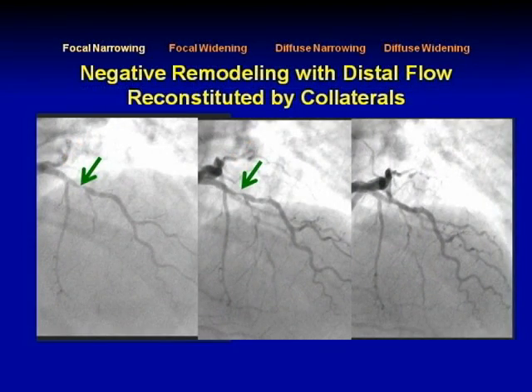that distal opacification. These are patients who have chronic ischemia, and then they have the collateral flow. Since our imaging is fast and we don't have these subsequent images, we're not very good at seeing the collateral flow. But what we do see is the distal opacification, and that's the sign that despite the severe stenosis, the good opacification distally will raise the thought that there is collateral flow there.